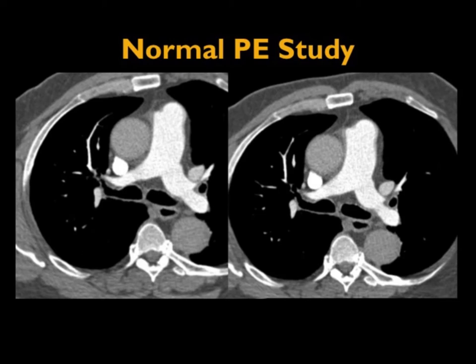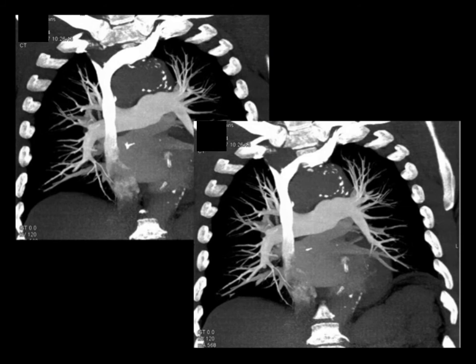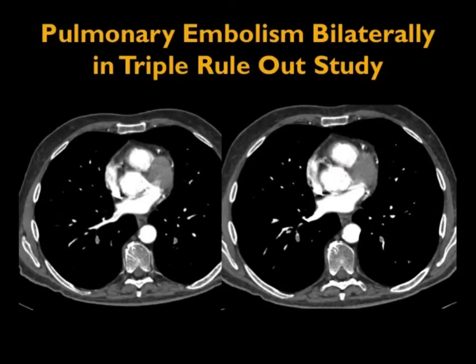Perfect visualization of main and the branch vessels. But look at the aorta. There's no or minimal opacification of the aorta. It's a terrible aorta study. And you can see why. The contrast is early. There it is in the SVC into the pulmonary arteries. Great look at the pulmonary arteries, but you need to have both the pulmonary arteries as well as the aorta and coronary arteries. Another example, here's a good case. Now you see good opacification of the ascending and descending aorta.